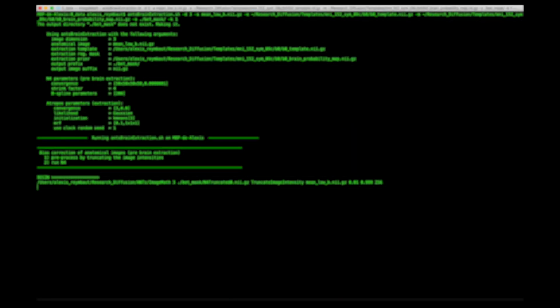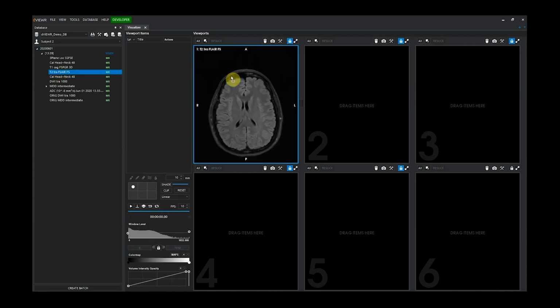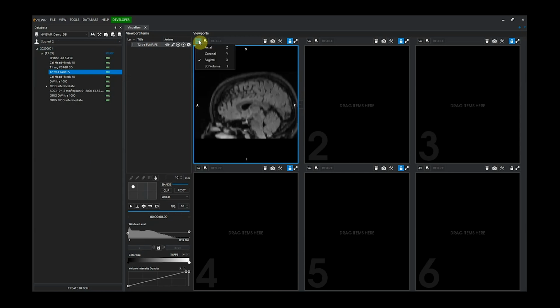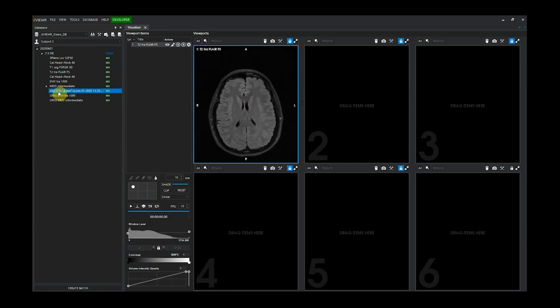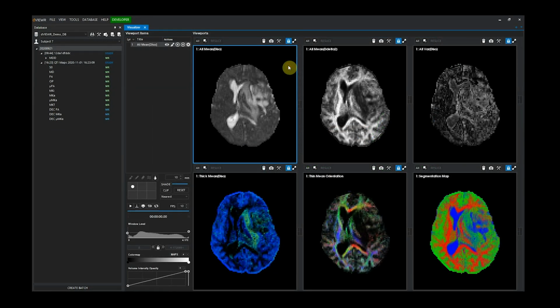Before dVIEWR, analyzing MDD data was mainly limited to researchers with advanced computing skills. In order to make it accessible to more diverse scientific user groups, such as clinical researchers and radiologists, we have launched dVIEWR powered by MICE Toolkit. This suite of customizable software visualization and workflow analysis solutions are designed as an intuitive tool enabling anyone to correlate unique diffusion MR contrasts with specific microstructural tissue features.